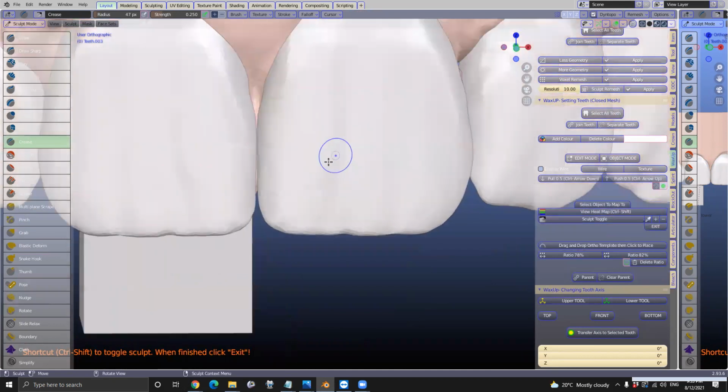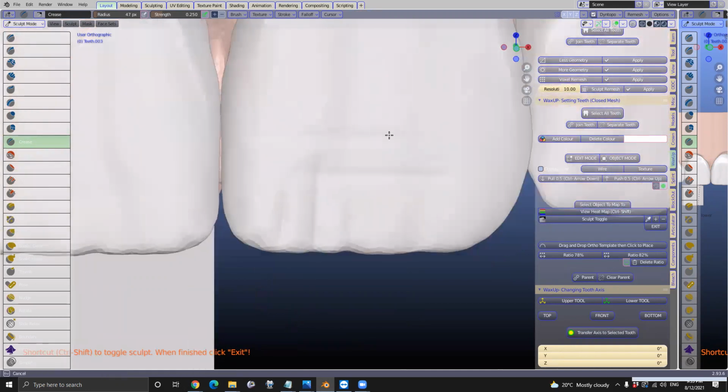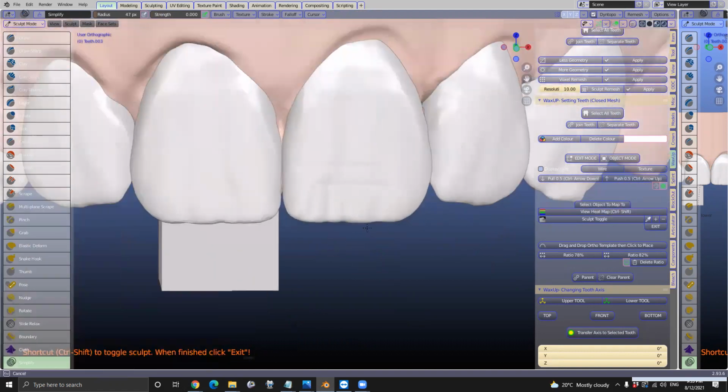This takes a little bit of practice. You can see how it's been creased. Can you see? Yeah. So you can do quite a lot. You can do your own sculpting and surface texture if you want to, but you've got to set it very fine. Then you see how I've just created a few lines there.